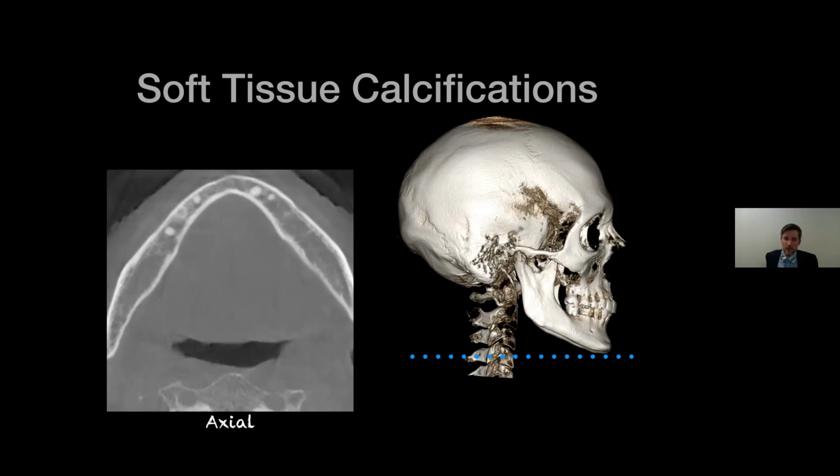The voxels, the cubes, the 3D pixels that we use for discussing resolution with cone beam, are actually the same size on all sides. A voxel is like a 3D pixel, and all sides are equal. So that means for you as a practitioner, if you are looking at a scan, no matter if it's the axial, sagittal, or coronal view, that measurement should be the same. The only error will be in the finger movements used to create that particular measurement. So it's 1-to-1 anatomically accurate.